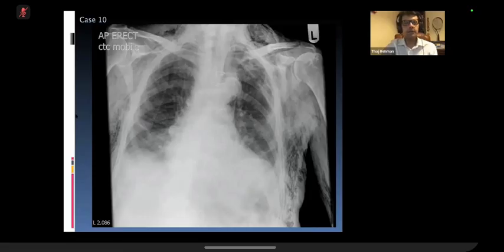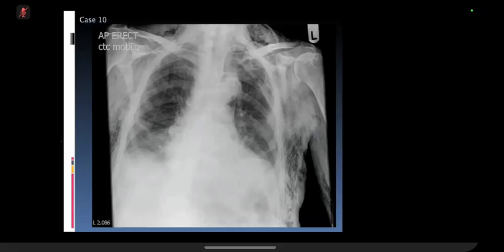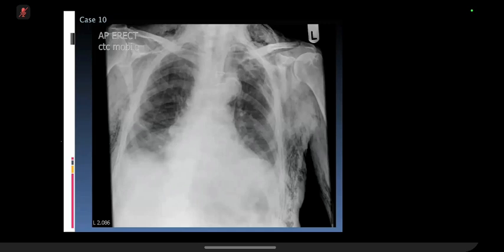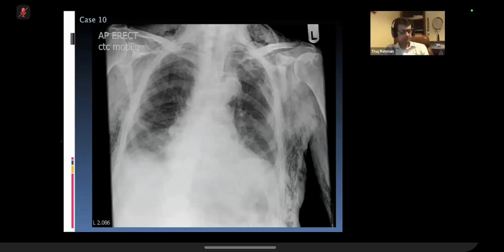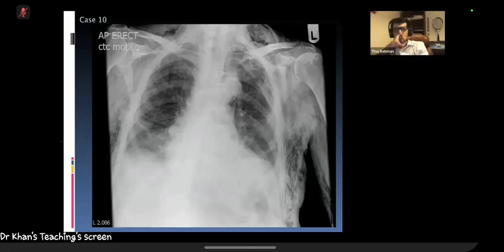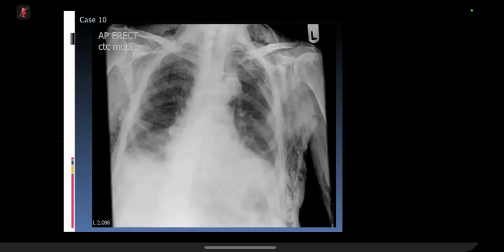That's very good. So this X-ray is for you. Okay, thank you. This is an AP erect radiograph of an adult patient. The most apparent abnormality is the presence of gas throughout the soft tissue, in keeping with surgical emphysema. I wonder if this is a traumatic injury to the patient.